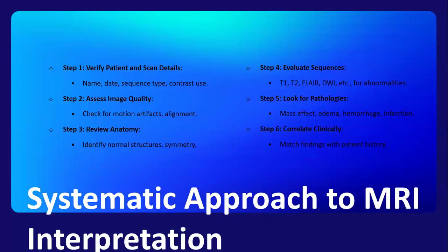Then once you've described the anatomy using your T1 MRI, you use your T2 MRI to describe if there's any pathology, then go to your FLAIR. Okay, so I normally like going to T1, T2, then you go to your T1 with contrast. Then you go to your T2. Remember we said FLAIR would commonly arise from your T2. Then you go to your DWI and ADC maps. That's what you're looking at.